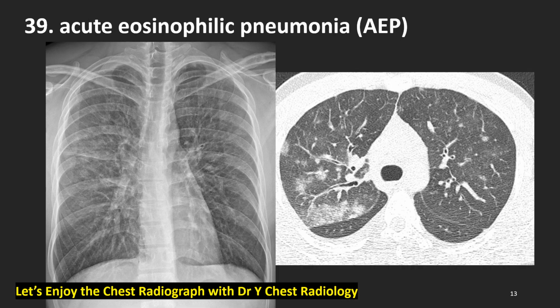This is a somewhat unique disease, acute eosinophilic pneumonia, in a young man or young woman who first smoked, not a chronic heavy smoker, just smoked several days. This chest radiograph shows interstitial edema bilateral and ground glass opacity bilateral.